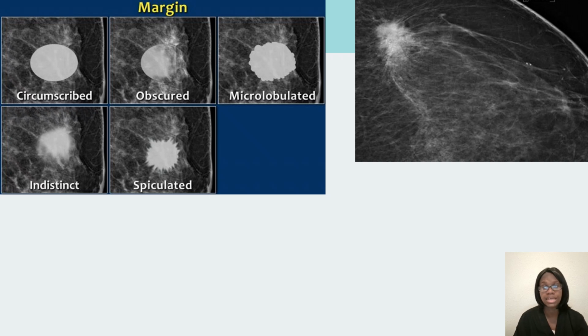So it's on my right, right above me. You can see how this image looks exactly or very similar to the margins in this other picture. So you can study the margins, make sure that you know how it's looking, of course, whenever you see it on an actual mammogram.